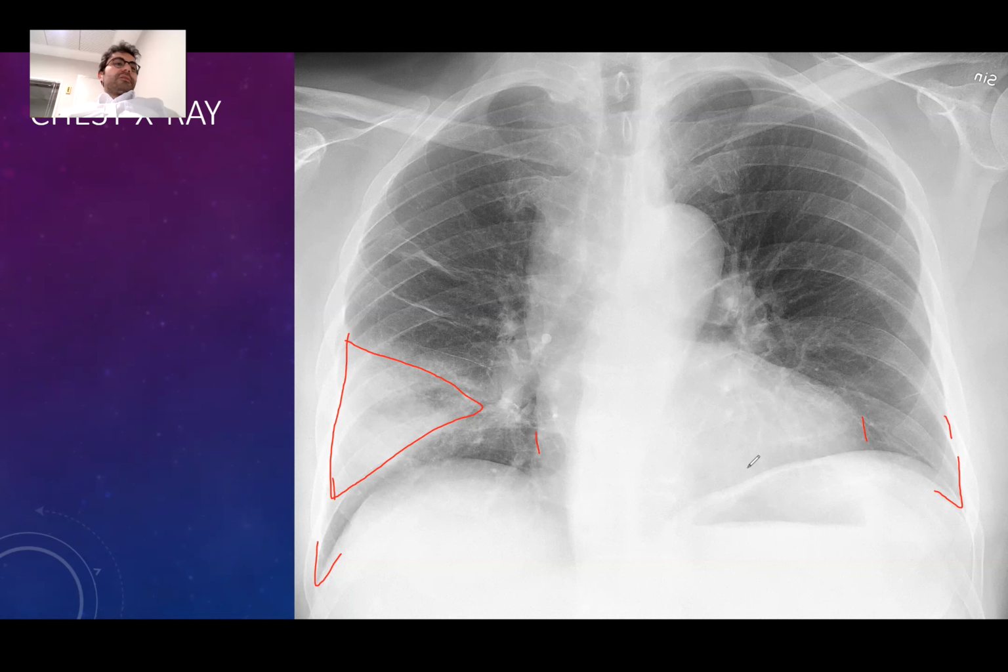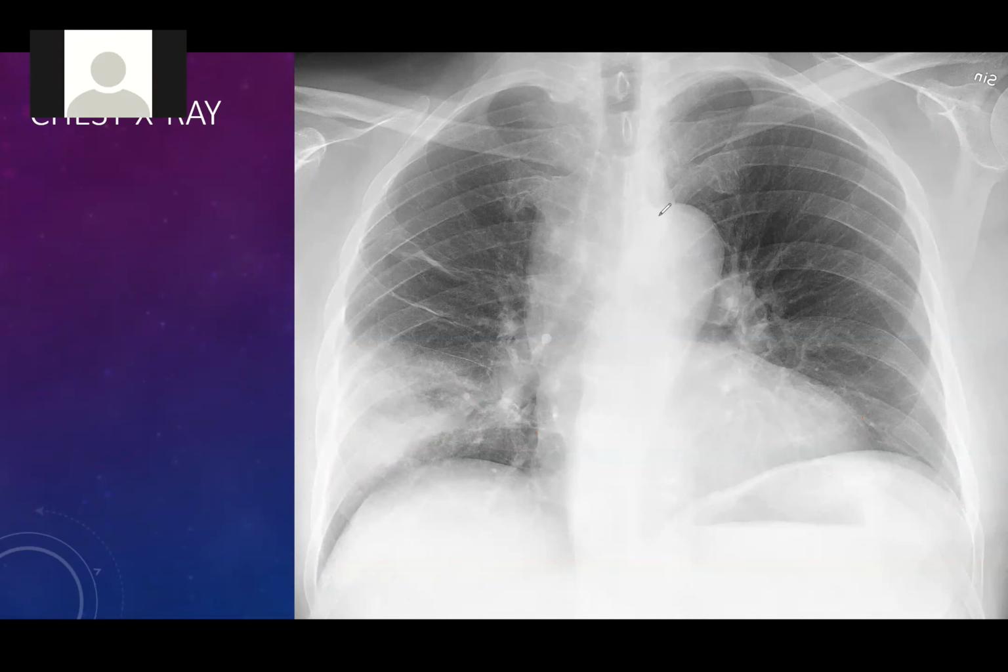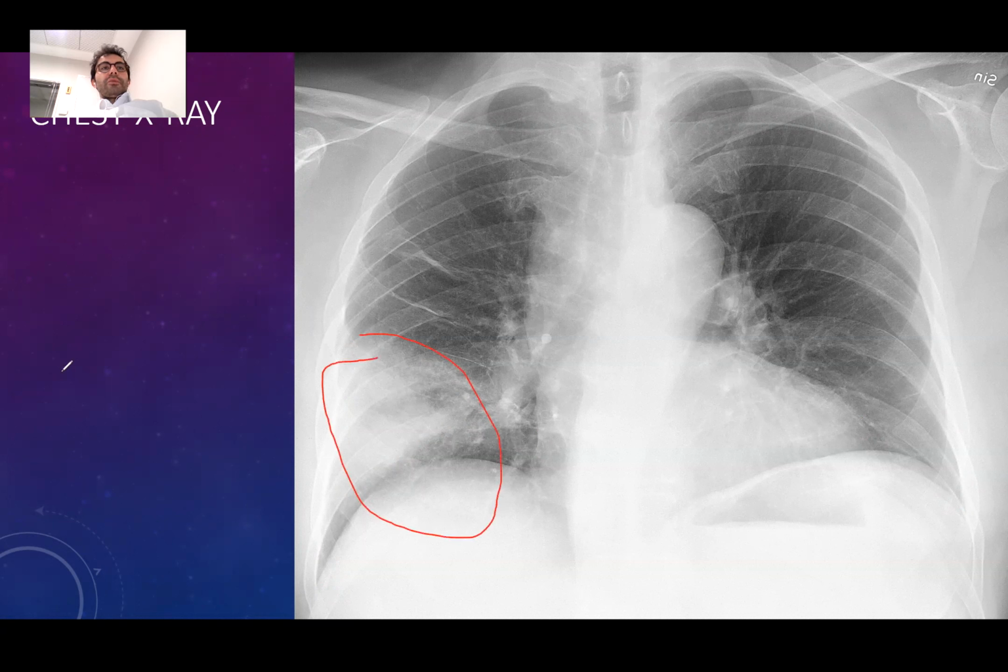What is this? How do you define this radiologically, Abdullah? I think it's lobar pneumonia because of the classification. Yes. But this is an airspace opacity, right? In terms of airspace opacity, this is an alveolar opacity, right? So what do we call this? Consolidation. Great. Okay. So it doesn't have sharp borders. It is resting on the pleural line. So this can be lobar pneumonia.